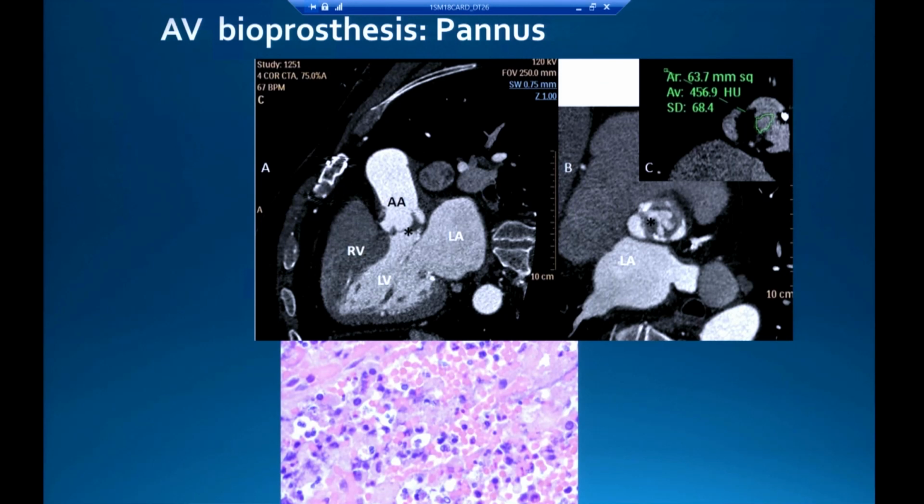So this is a bioprosthetic valve. I think this is the main thing about CT: it puts into context, from an anatomical standpoint, what you see in echo, right? In echo, you might be able to see some abnormality or suspicion, but with CT, everything comes into picture and makes a lot more sense. You can see this tissue ingrowth, and no wonder it will hinder the opening of the valve and cause obstruction, right? This is an example that we had when we started our program, confirmed by surgery.